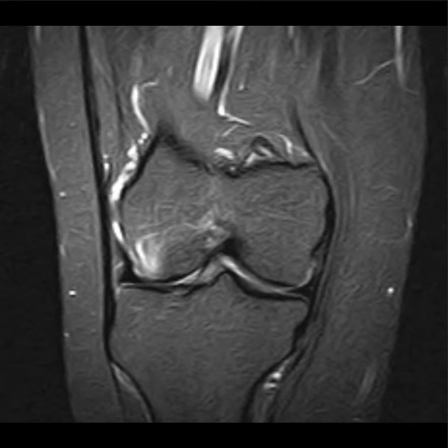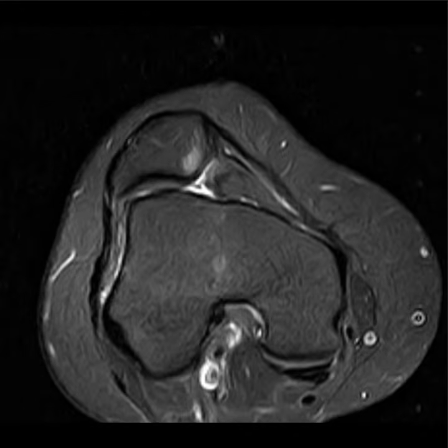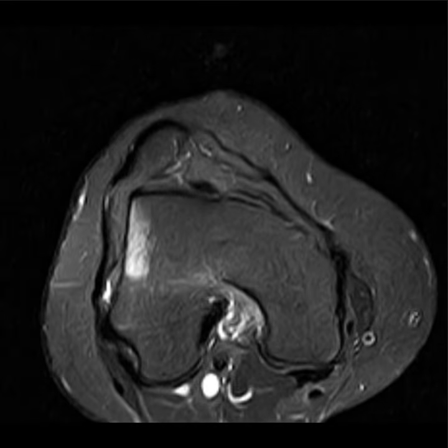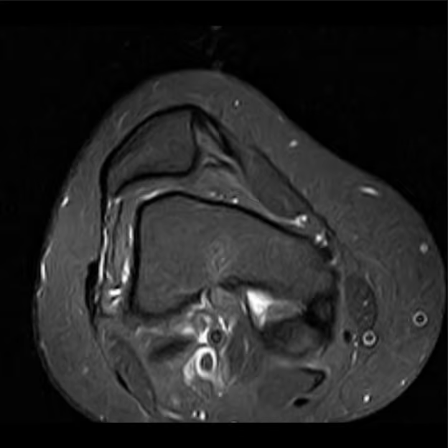Good. You have to see all kinds of images. So these are the axial images, and what do you see here? Oh, now I get it. Sir, you can see that the anterolateral aspect of the lateral femoral condyle is edematous, together with some bone marrow edema seen on the medial aspect of the patella, and if we look carefully, I think there's some edema of the medial patellar retinaculum.